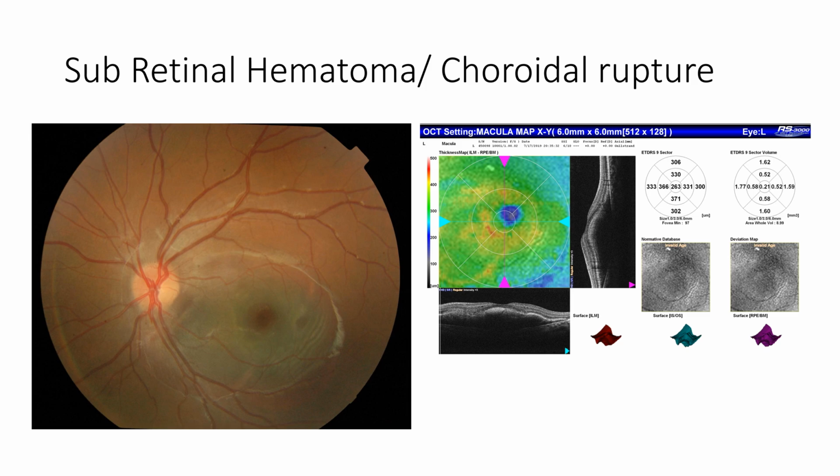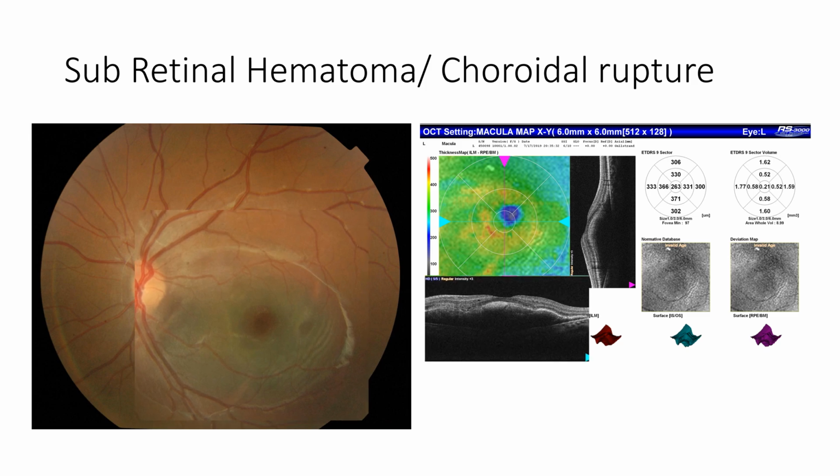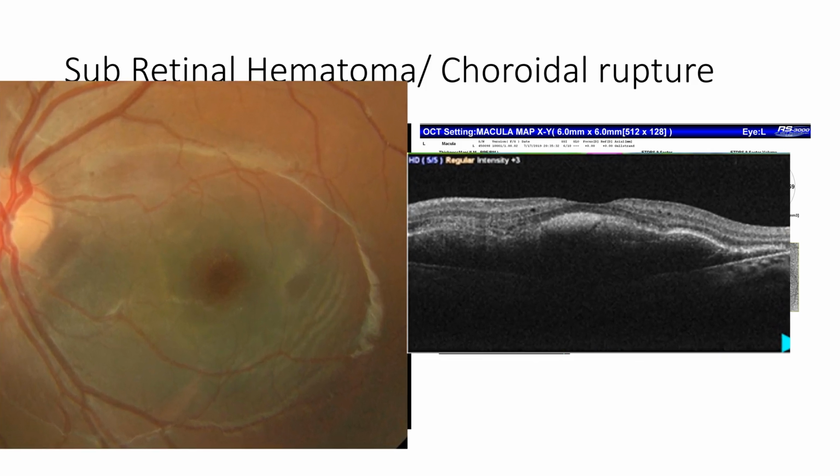Subretinal hematoma, as can occur after trauma. So this is one child who sustained injury by a ball, and we can make out this portion is slightly elevated, and we can see a slight discoloration of a slightly greenish hue, which comes when you have subretinal blood which is collected here. We can also make out some corrugations in the retinal tissue because of distortion of the tissue as caused by this hematoma.